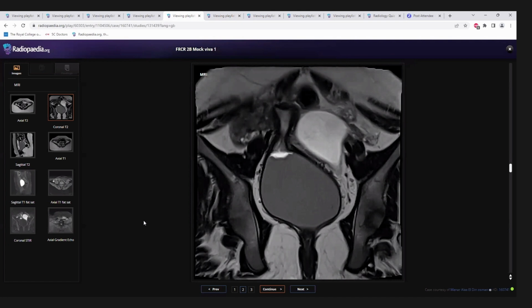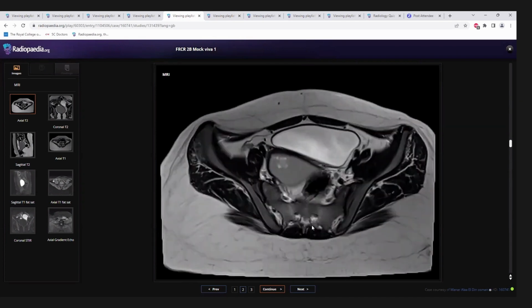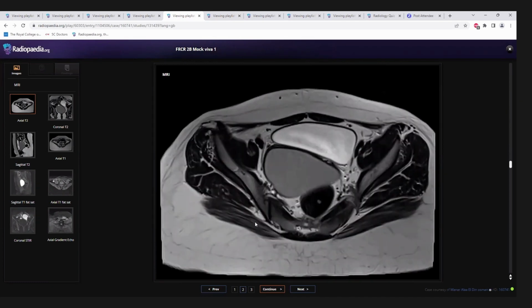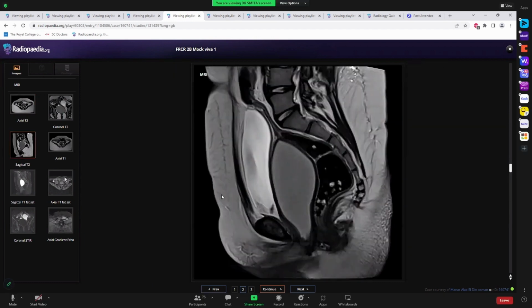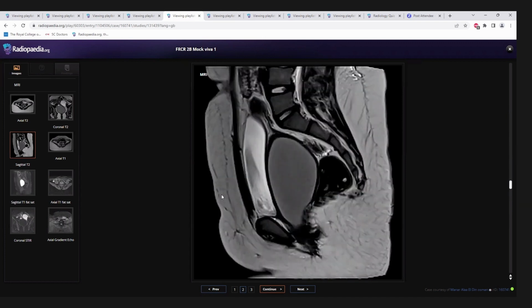Okay, this one was spot on. First you went and on the axial image you said it's an endometrioma. Always go through all the images, please. Don't jump to a conclusion because it will be very odd to change it later on. And this is a spotter. You know, you don't want to miss.